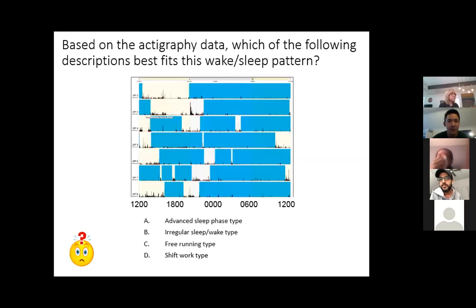Yep. What is this? A hibernating polar bear, I'd call it. It seems more irregular.